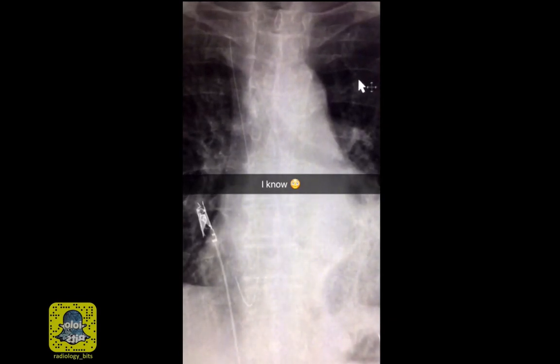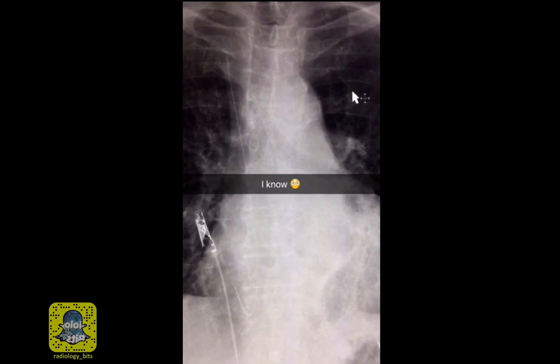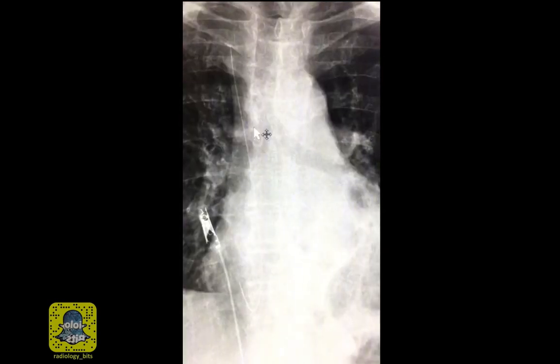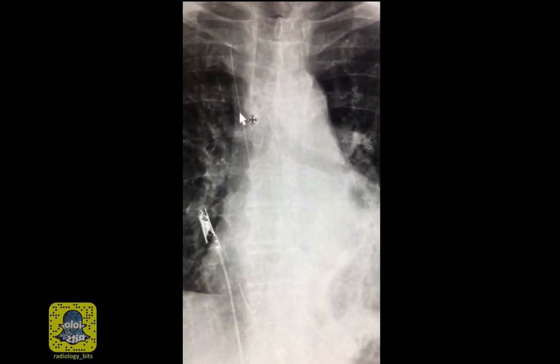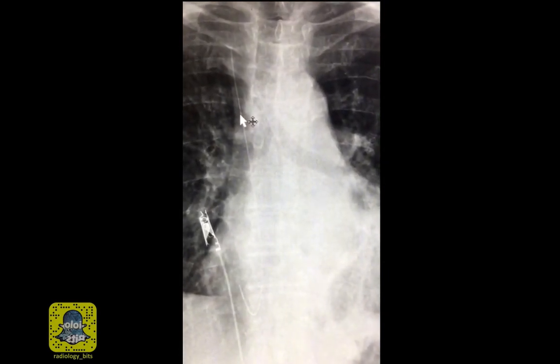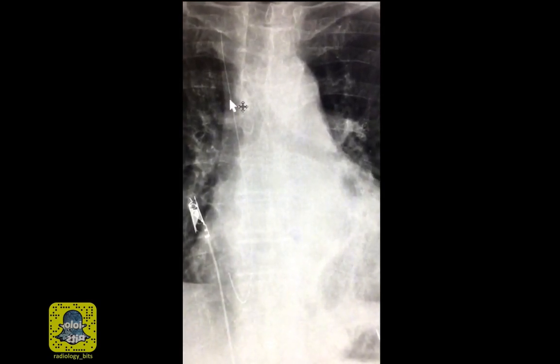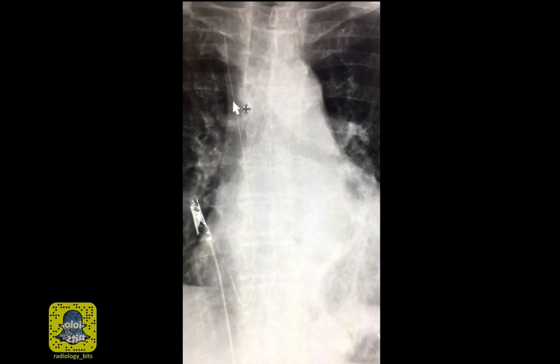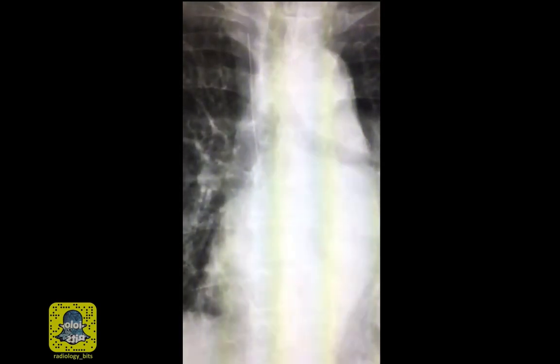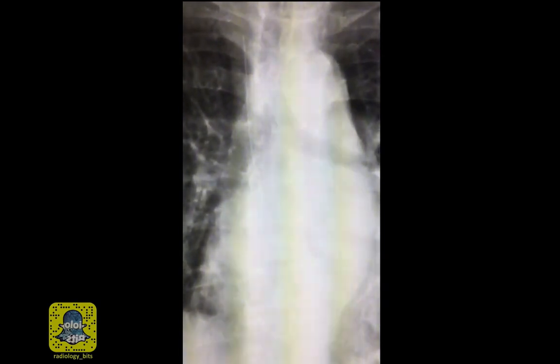Unfortunately, in this patient's case, this is part of the guide wire that slipped into the vessel and went unnoticed. The guide wire was hanging there in the same way we explained at the beginning of the case, and the patient was discharged with this. This was picked up on the follow-up chest radiograph and then confirmed by the CT scan that I showed. The guide wire did not cause any symptoms, which is something that we commonly see with accidentally embolized material.